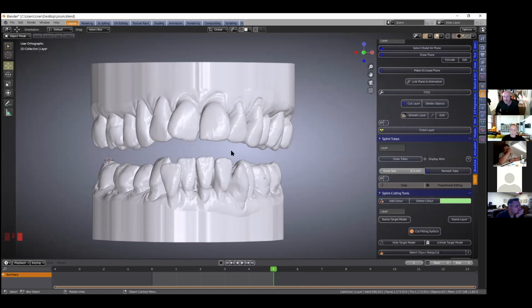And of course little Maryland wings and fixed bands and things like that. And it's the foundation of the denture module, because we need a layer, and then we're going to be joining teeth and gum onto that layer. So the splint module will become very handy there.